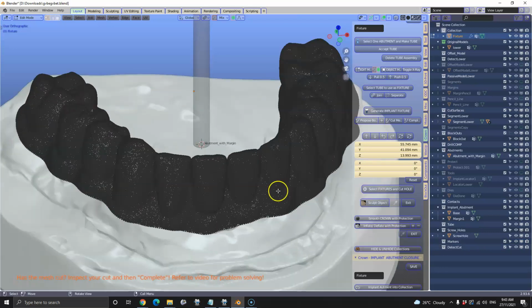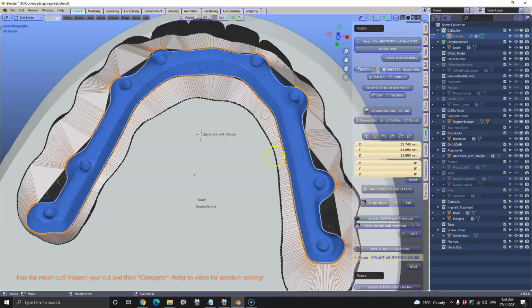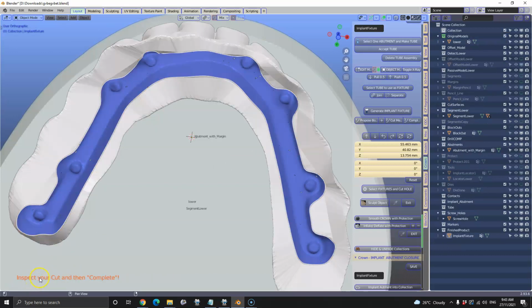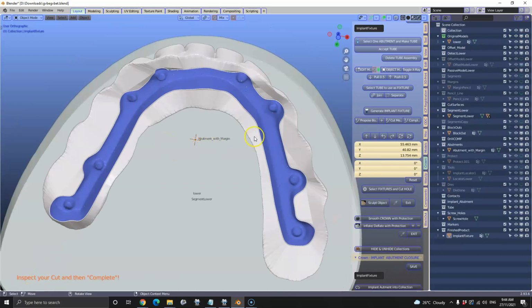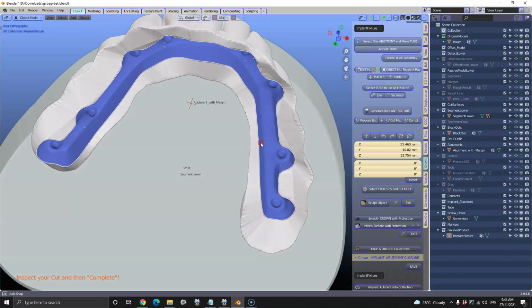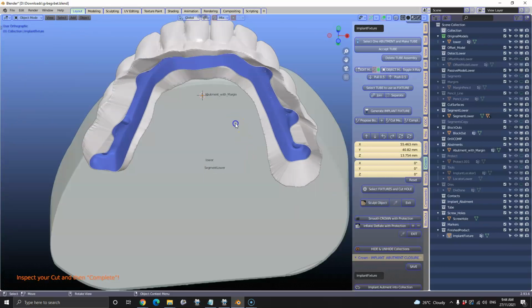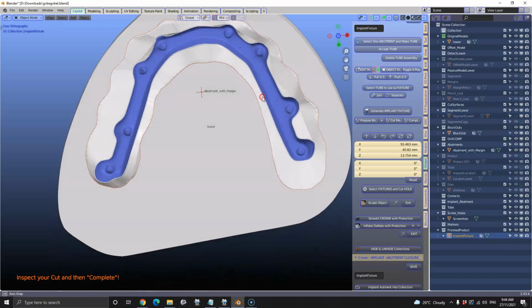Alright, so it's done it. I didn't expect that, but anyway, it's done it. And then complete. So this has taken me now 8 minutes, but if you know what you're doing without recording and explaining, it will then be a bit faster. Let's just have a look and see what we have here.